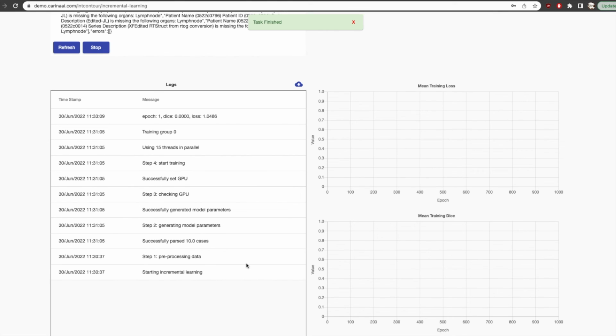If you wish to restart the model training process using the same data and information set up in the initial settings configuration, select Run Incremental Learning if you have pressed Stop. This will continue running the process of training a new model. Once InContour starts the incremental learning process, it is recommended to watch the log until you see epoch 1. This is an indication that all data are processing correctly and the retraining process has not encountered an error. The retraining model takes about 40 hours to complete.